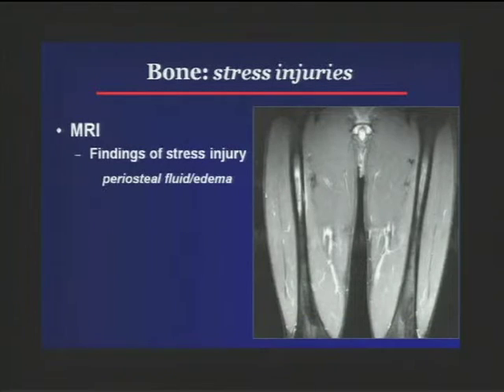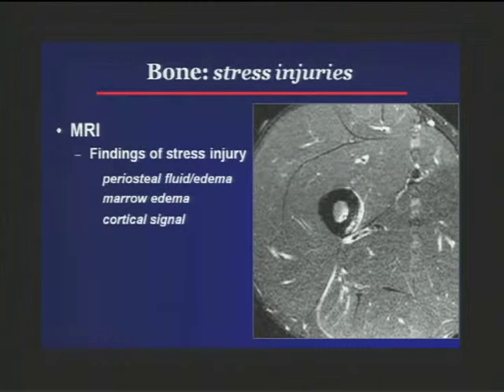Now this one is a little bit more flagrant here. And again, these will often kind of extend up to the very edge of your field of view on a pelvis. So I will always take off the annotation so I can look down in that corner on each of the femurs, because this is a very important lesion. That's in a weight-bearing portion of the bone that can snap if it continues unabated. And you can see in this case, this is one of our athletes, how significant this is. I mean, they've got periosteal change, they've got endosteal edema there, and then they've also got some cortical changes there with thinning and a little bit of high signal, developing a stress fracture in this highly weight-bearing bone.